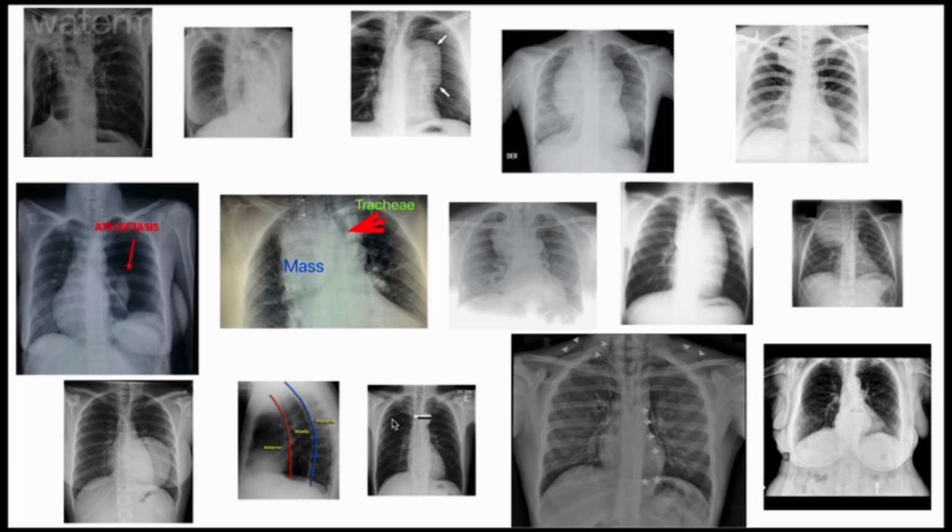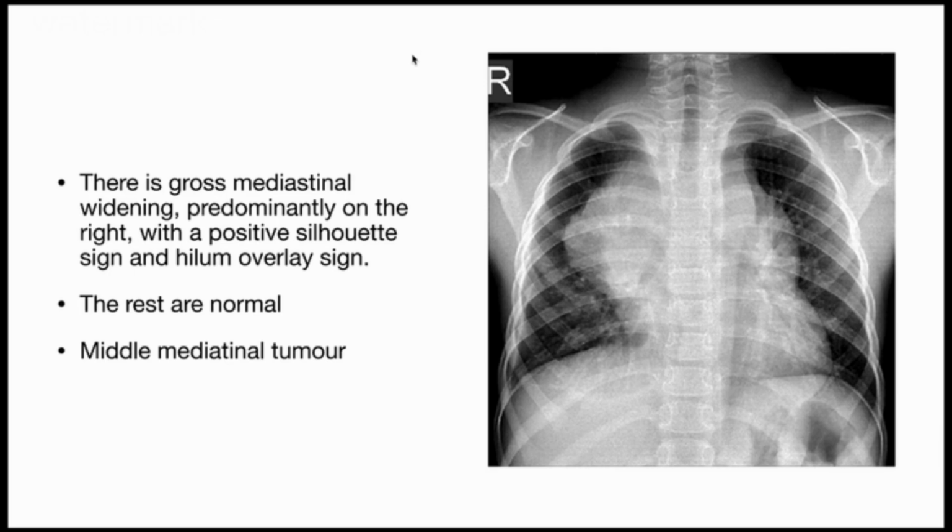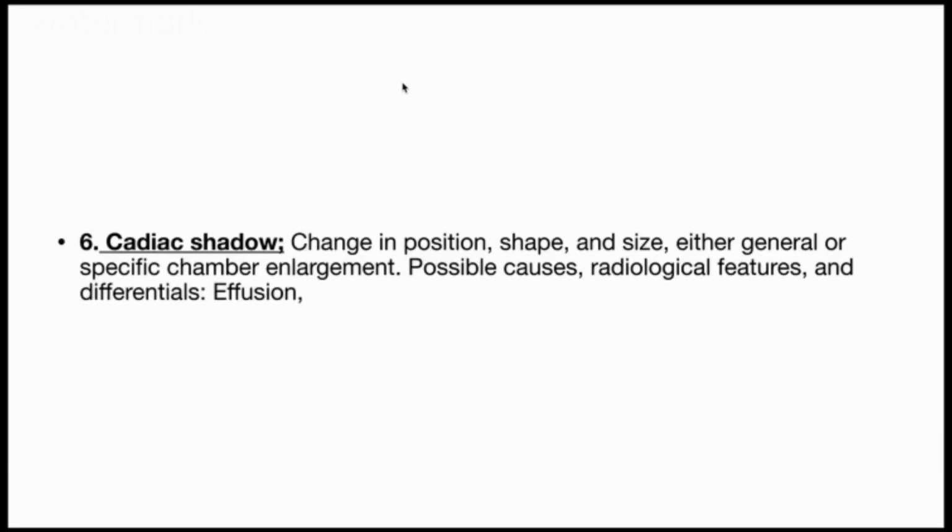Now, approaching the mediastinum, like I said, sometimes the mediastinum may be tracked to the area of involvement, and then we say there is loss of volume on that side. Like in this image you see it is tracked to the left, so we suspect probably that the left lung has collapsed. This one again, the lesion shows beautifully there, it distorts the mediastinum. So in this case, we describe it as an enlargement of the mediastinum.